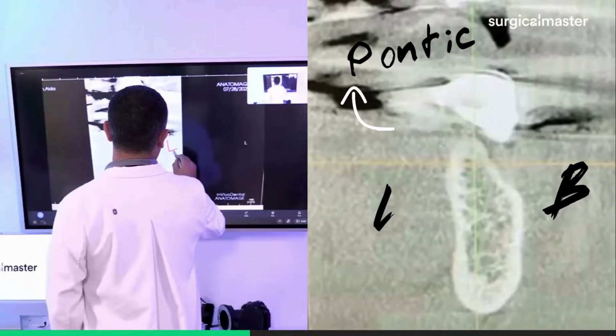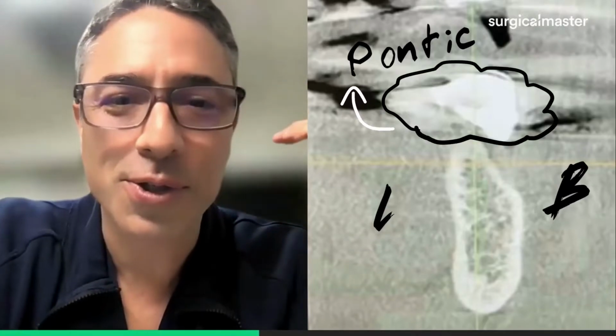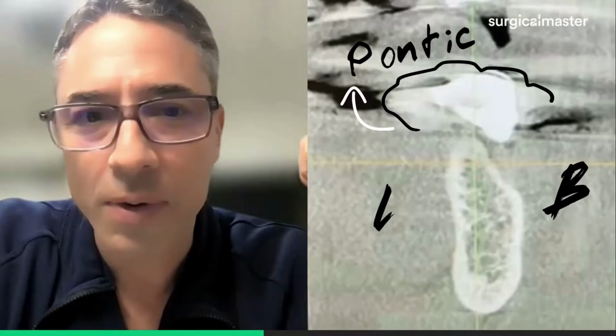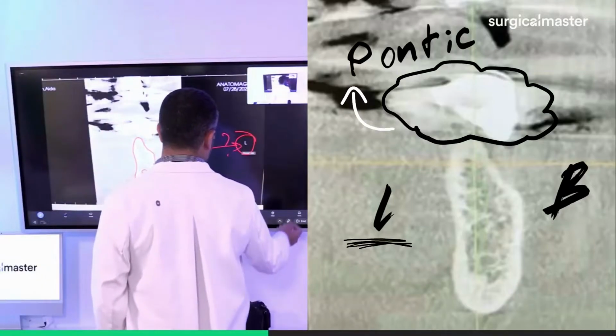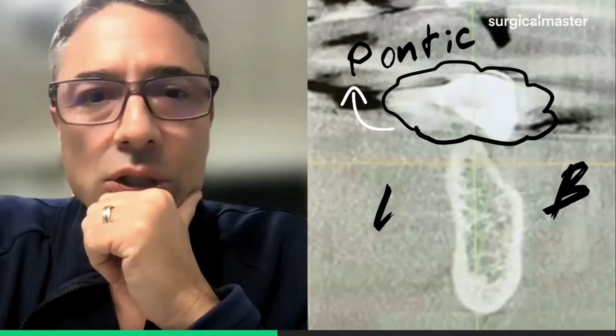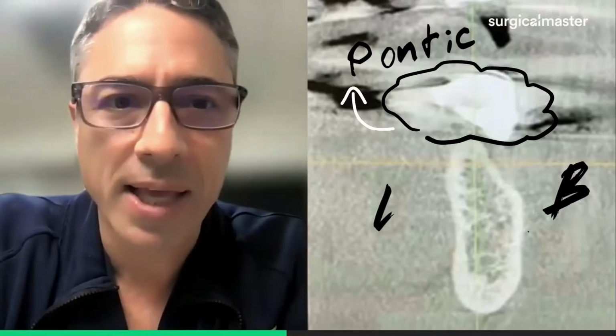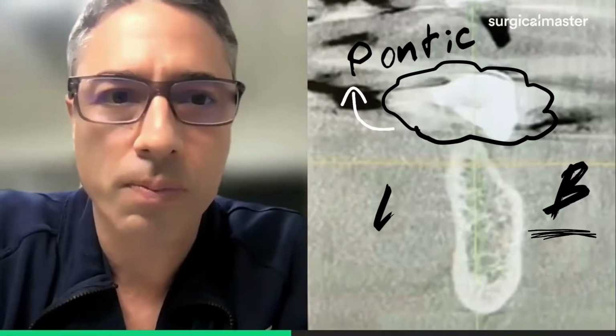Is this lingual or buccal, this one? That's buccal. It says lingual? Or L, what does this L mean? No, it's left side probably. Okay. So here are the 2 reasons we know it's buccal. The buccal plate is resorbed, the lingual plate is more present.